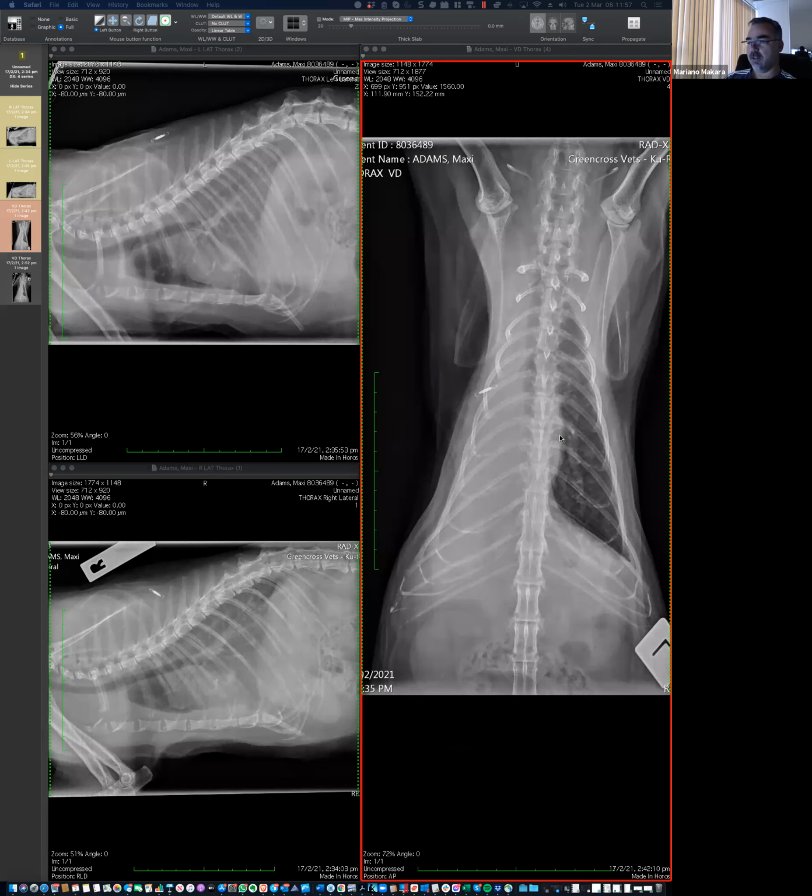Any other finding? Yeah, I think the liver might be enlarged with a rounded border. Okay, good. It's a bit irregular up on the top there in that one. Okay. Yep, I agree.